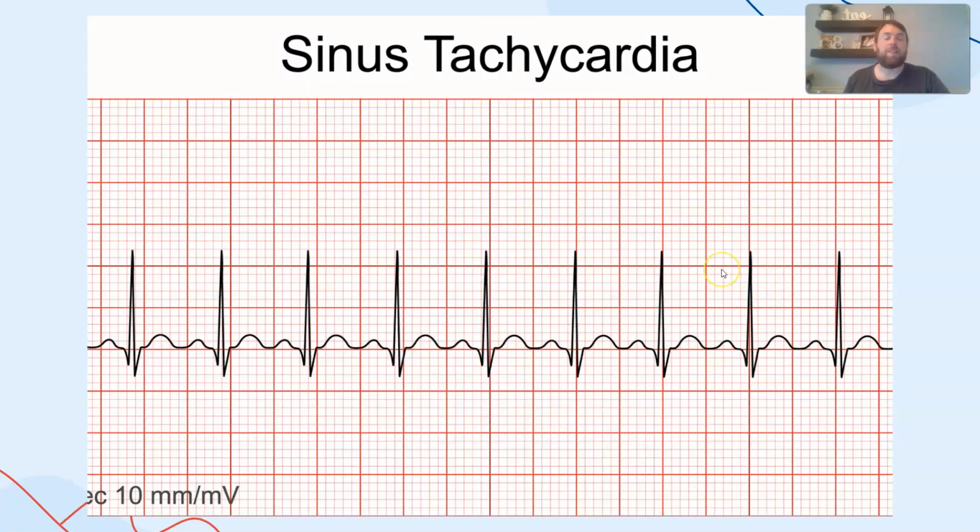This individual is experiencing tachycardia, which is defined as a heartbeat faster than 100 beats per minute. That is not a good thing. That is a heart that is working way too hard. If we notice the space between the two heartbeats, I should say, between the T wave and the P wave here, the end of the T wave and the beginning of the P wave, it is barely over maybe a fifth of or a 20th of a second here.